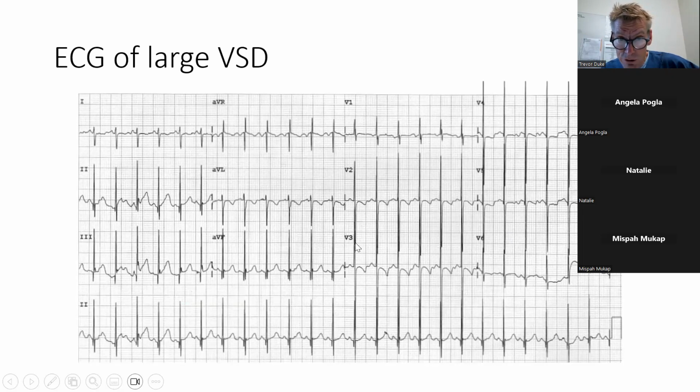So it's a fairly deep S wave. The S wave is looking at depolarization of the left ventricle, right? Because it's a negative deflection that's looking at the left ventricle. It takes a bit to get used to that, but knowing about the lead placements and knowing what ventricle that particular lead is looking at helps you in understanding this.